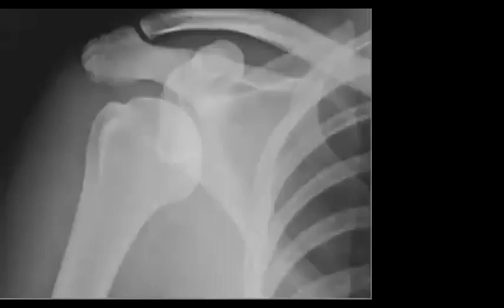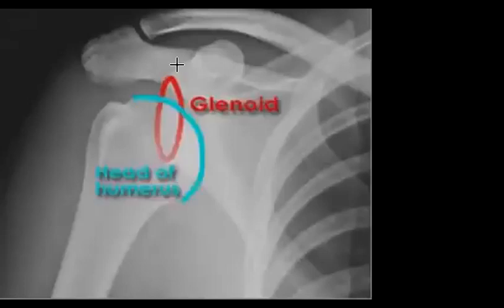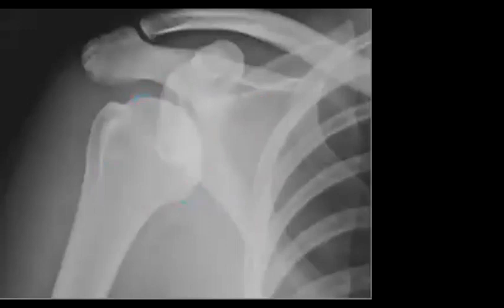Yeah, anterior shoulder dislocation, Ermin, thank you. So you can see that the alignment between the glenoid and the humeral head is disrupted. So the humeral head lies inferiorly, okay? Or you can consider it below the level of the coracoid, yes. So when you find it like this, it means that there is anterior shoulder dislocation.